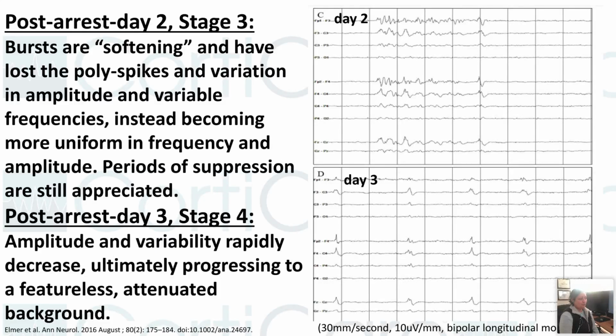Okay, so what's happening on day 3? If you see, we are losing all the background frequencies here. On day 2, you would think, okay, it's getting better. But by the time day 3 came, now the suppression has increased and that background activity has become generalized periodic discharges.